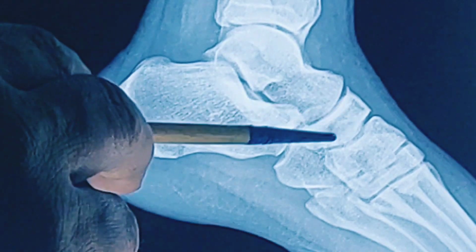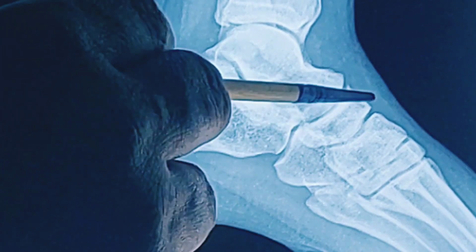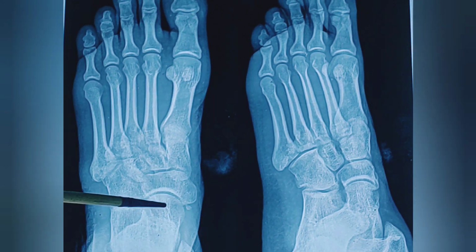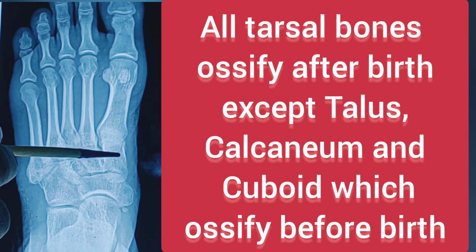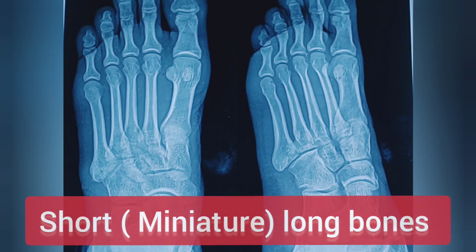The talus articulates with the navicular bone. This is navicular, and in this X-ray film you can see the navicular in front of the talus, and on the lateral side this is cuboid, I told you already, and these three are the three cuneiforms: medial, intermediate and lateral, and all these are metatarsals. The metatarsals are examples of short long bone or miniature long bone.